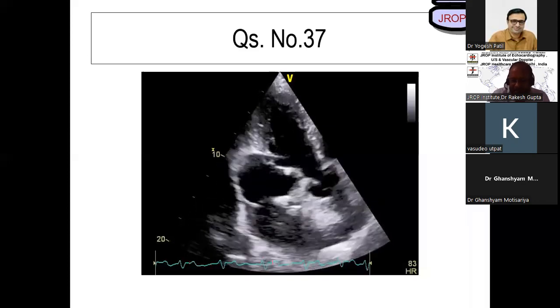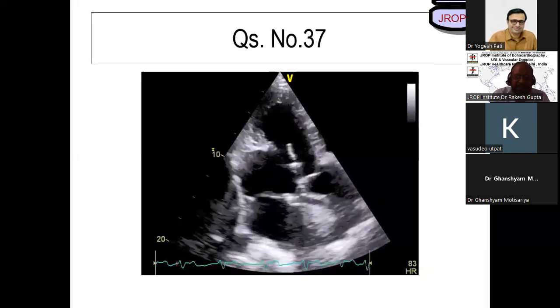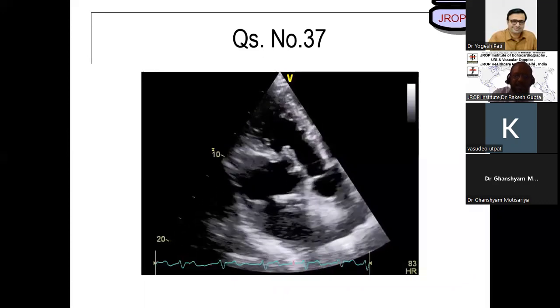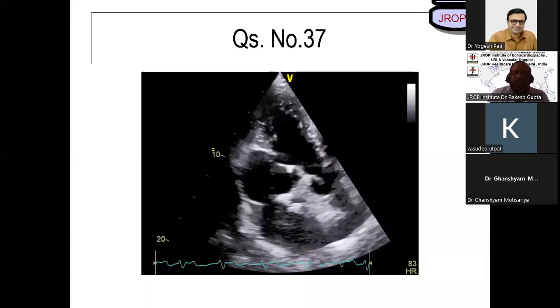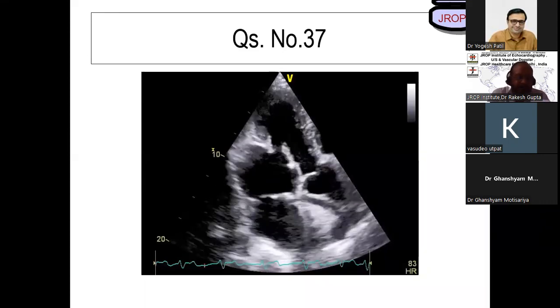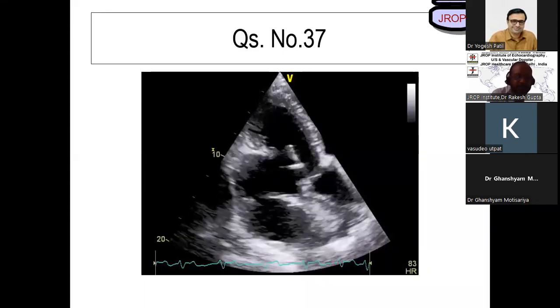Anyway, this is what we are sometimes left with when we're in a hurry and do scanning echoes. This is scanning echo syndrome.